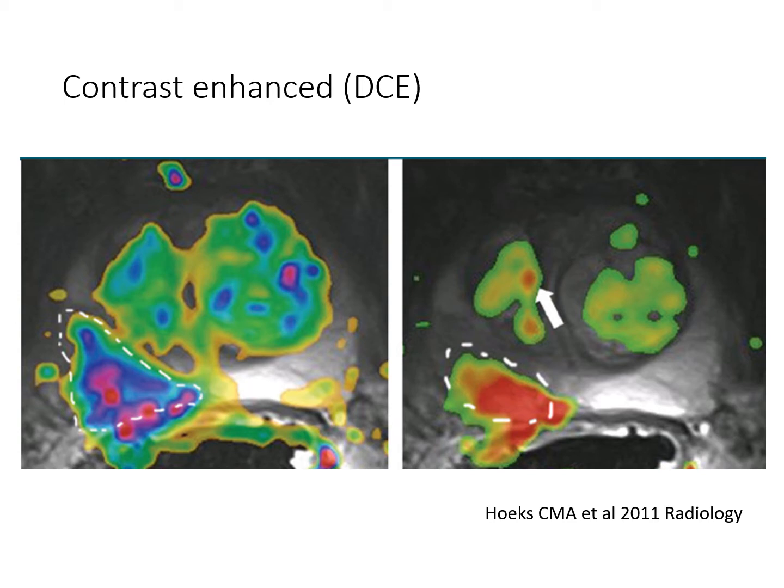Once you've acquired all that data, you can use software to get these nice maps to look at the speed with which the enhancement occurs. Basically, wherever there's cancer, you'll get this rapid wash-in of contrast, highlighted by the more red color. So that's the kind of fancy stuff you can do.